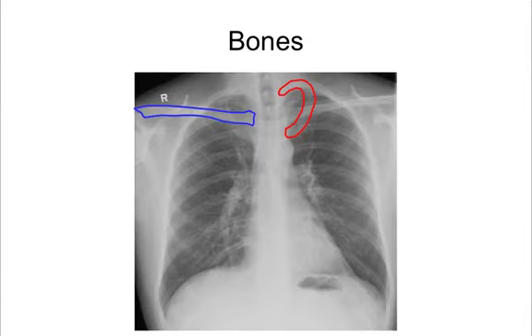I like to start looking at a radiograph from outside in, and this is to spot any obvious abnormalities that you can miss when you just focus on the lung fields, such as an absent humerus or clavicle, obvious fractures or surgical emphysema. I then like to look at the bones, which also helps with assessing the adequacy of the technical aspects of the film, as Aggie has just mentioned.